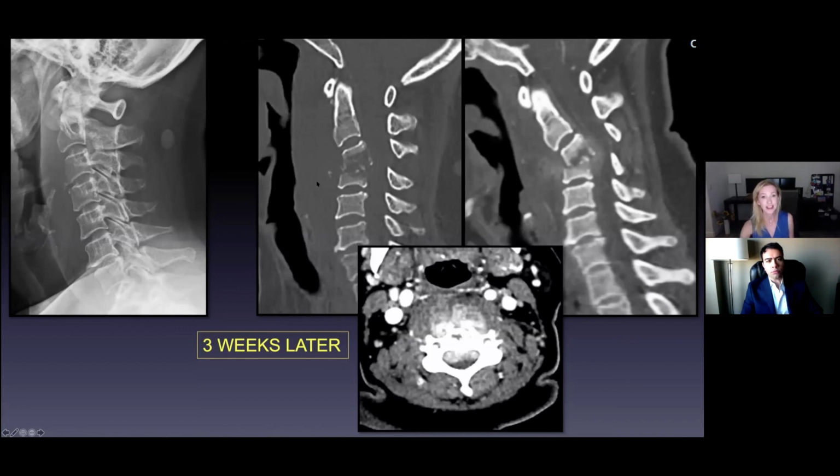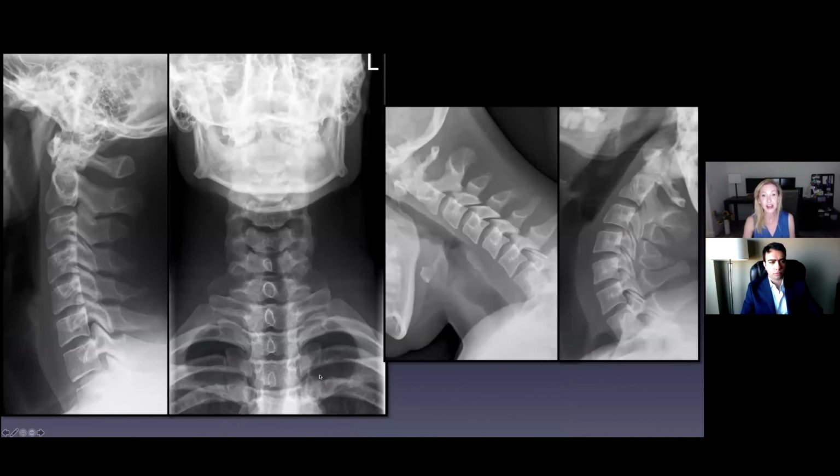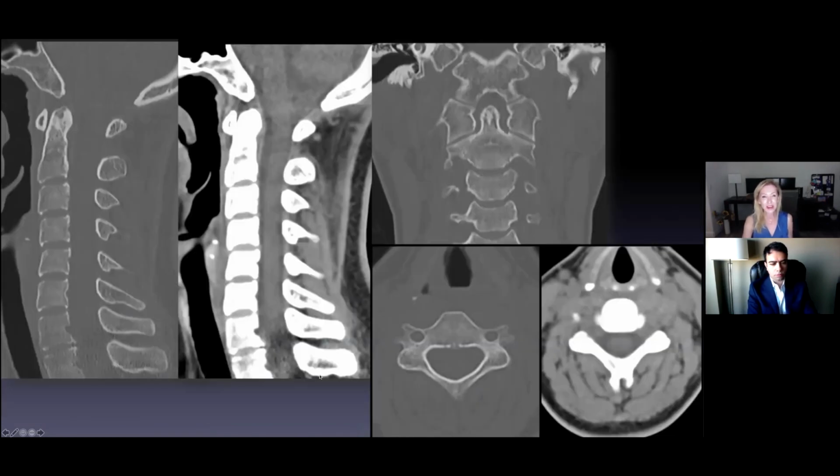They're not all this dramatic. They're not all this bad. But let's go on, and we will talk about surgical approaches too. Let's look at a few other cases. I'm actually not going to show this. This was a little bit of normal anatomy review, but I think we're not going to get through our 70 slides, so we'll skip through the anatomy for right now. Just take a look as we go through, though. We were talking about the normal alignment, the normal disc space height, the normal canal width. This is what normal prevertebral soft tissue should look like. You can see the difference between this and the case I just showed you.